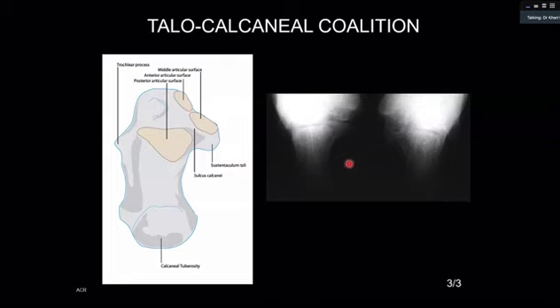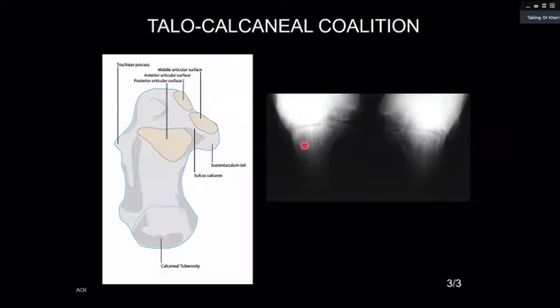Now, your normal anatomy is that if you see, this is the sustentaculum tali. This joint here is the middle joint, right? Look at this middle joint, and you will agree that there is irregularity. Look at the joint space. The joint space is reduced, irregular. Look at the marginal sclerosis. So indirectly, there is a coalition, but this coalition is not bony. So this is subtalar coalition.